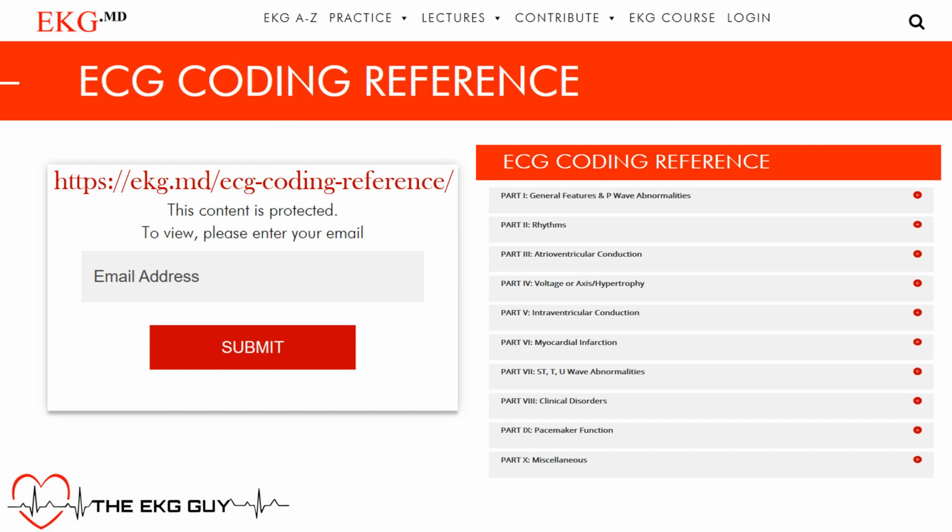So we've been going through this EKG coding reference guide that is available online, and what many of you have asked for was to combine the different sections of this into one part. The reason behind that is so you didn't have to go through all the videos separately. What I'm going to do here is combine the AV conduction delays, so the AV blocks. Okay, so part 3, this is one that many of you have asked for, so I'll combine them all. So you'll look at first degree AV block, you'll look at second degree AV block, Mobitz type 1 or Wenckebach block, and type 2, and you'll look at third degree AV block in this lecture.